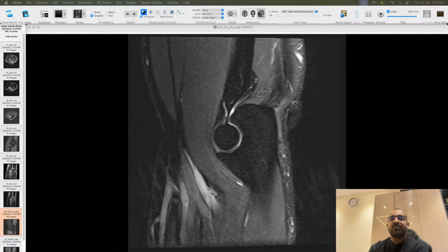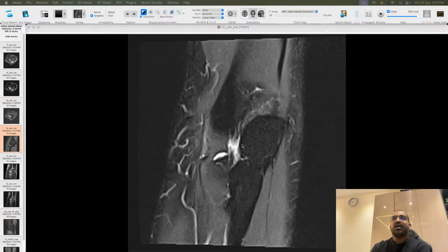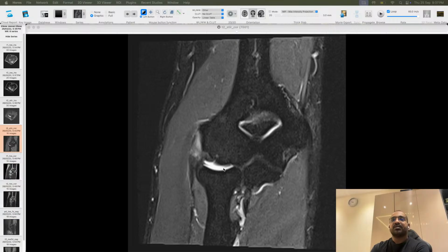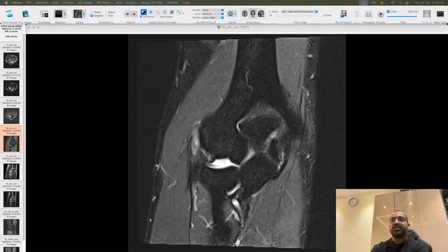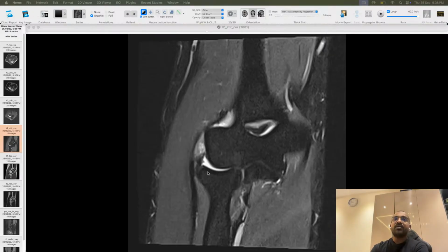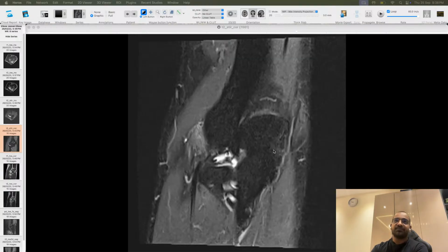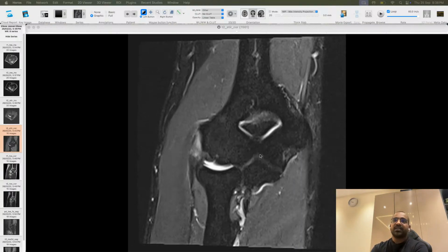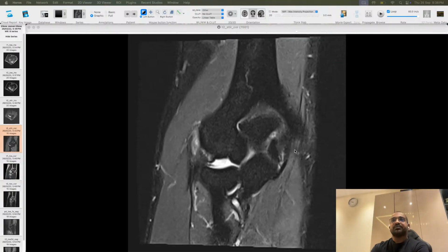If there is some fluid, say some subarticular erosions are there here, and there is fluid only, a significant amount of fluid only in this compartment of the joint, how do I mention it? It is the radiocapitellar joint. If you say this, it is the ulnotrochlear joint. So ulnotrochlear and radiocapitellar joints, we can mention them separately. So this is the ulnotrochlear joint, this is the radiocapitellar joint.